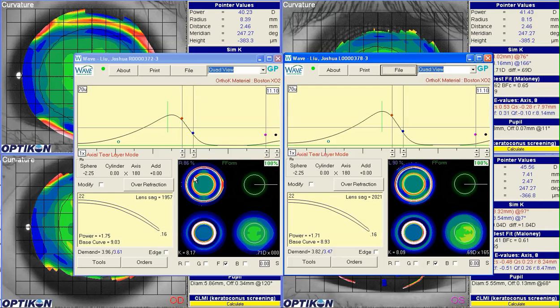So here's the right lens, and it looks pretty standard. We've got a little bit more power than we normally would expect for -2.25, but no problem. The cornea is kind of flat, and especially if the patient has a history of being a little bit undercorrected, then that's not totally unexpected. Like I said earlier, the only unexpected thing is that the patient's not getting any subjectively improved vision, even though we're getting 2 diopters of change on the cornea.